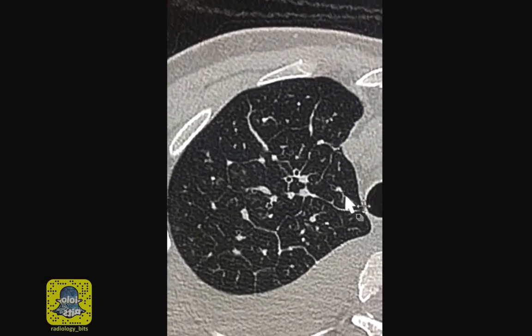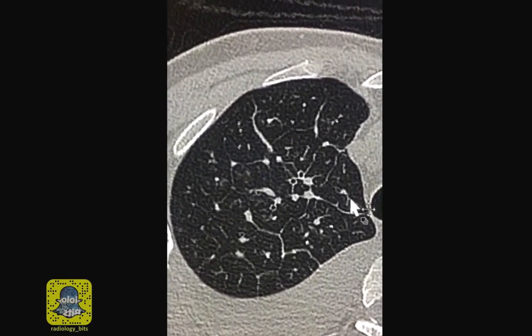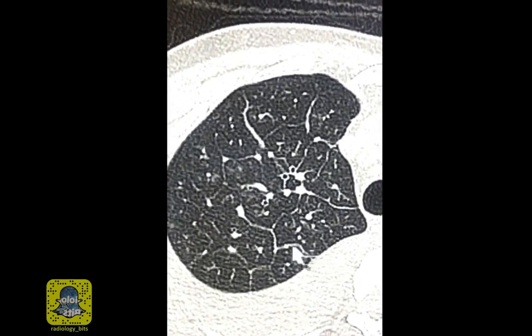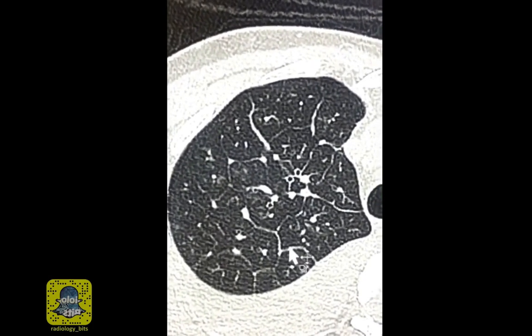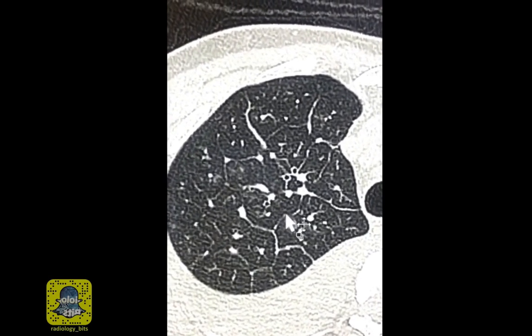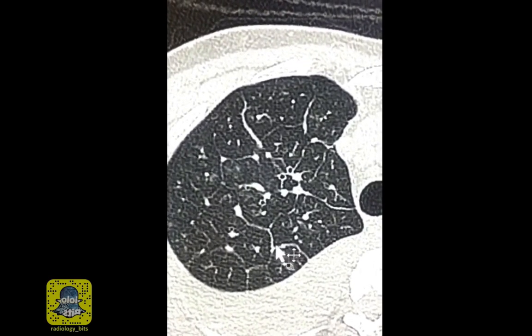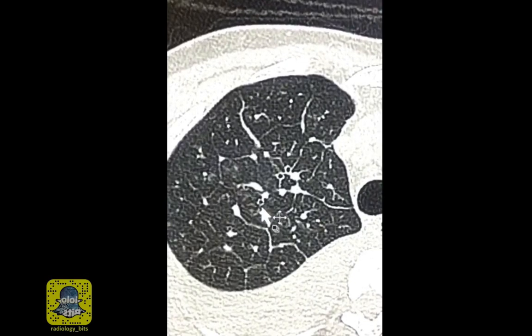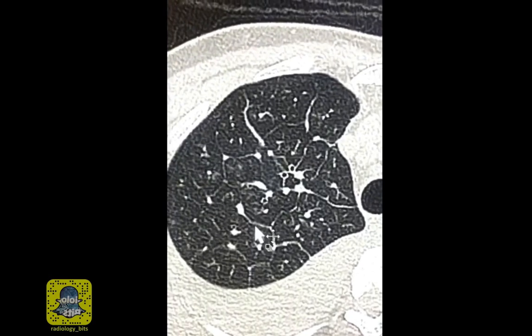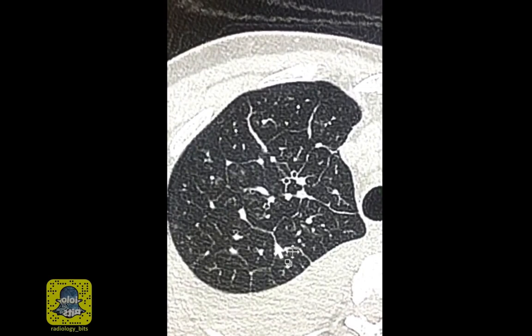Let's summarize what we learned from this case. We learned that there is something called the interstitium, which is the backbone of the lungs. We learned that part of the interstitium is called septations. Septations form geometric structures, which are the smallest building blocks of the lungs, called the pulmonary lobules. A pulmonary lobule contains veins and lymphatics in the periphery and a small airway and adjacent small artery in the center. We now know that these septations may be abnormally thickened, and if you see that, divided into smooth, nodular, or irregular.